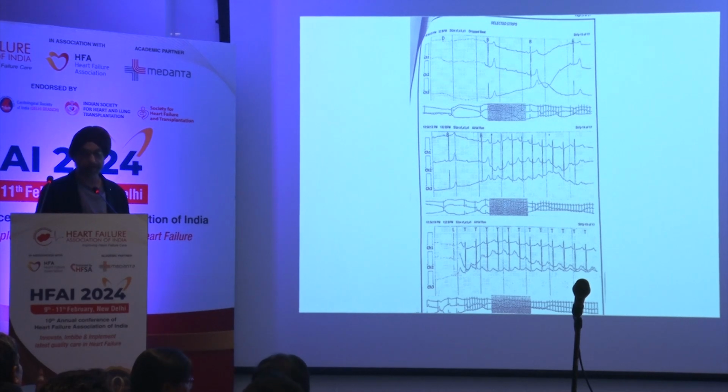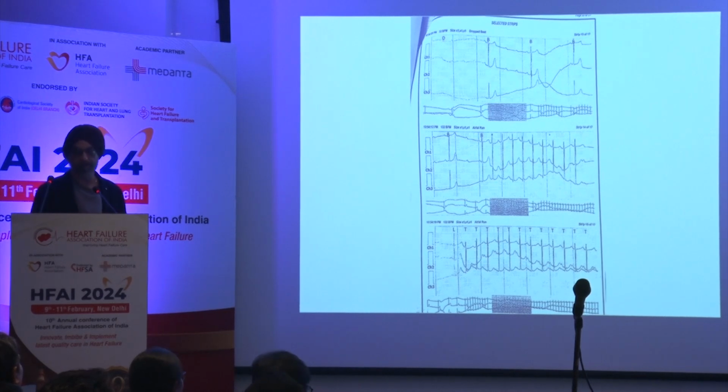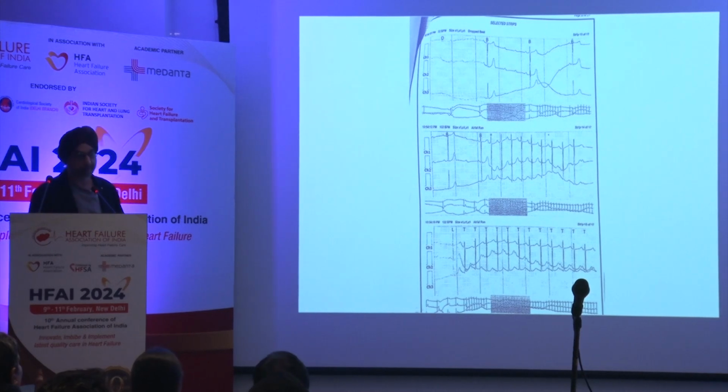So it's a condition which very few people actually know, and what you don't know, you will never see. Your eyes will not see what your mind doesn't know. But in a young individual, missing this diagnosis can be risky and important. So this patient needs a pacemaker.